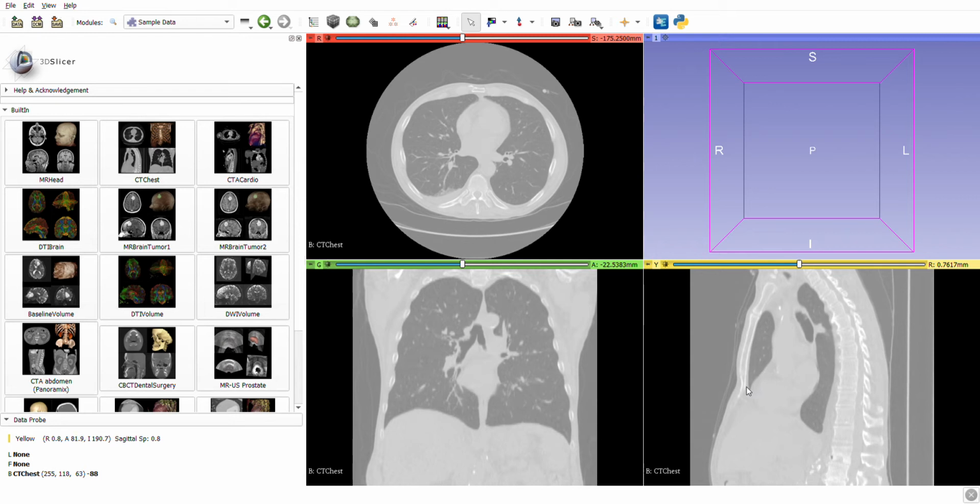Okay, now what is our field of interest? This is a CT scan of the entire chest. Now we don't want to print the entire chest, or generate the 3D model of the entire chest of a particular human body. So we are basically focusing upon the spinal cord. Now what I need to do is separate the spinal cord from this entire scan.